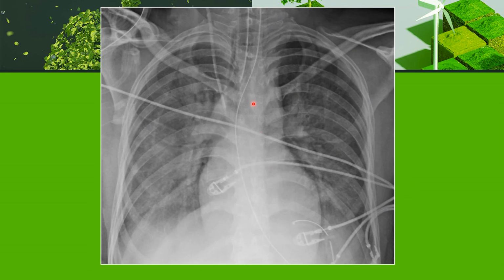Here we can see the X-ray of a patient with CNS injury, and you can see bilateral haziness, fluffy appearance like fluid, bilaterally. So many times in these patients, after seeing that X-ray, it was thought that this may be cardiogenic pulmonary edema or a case of ARDS, but actually it is not.